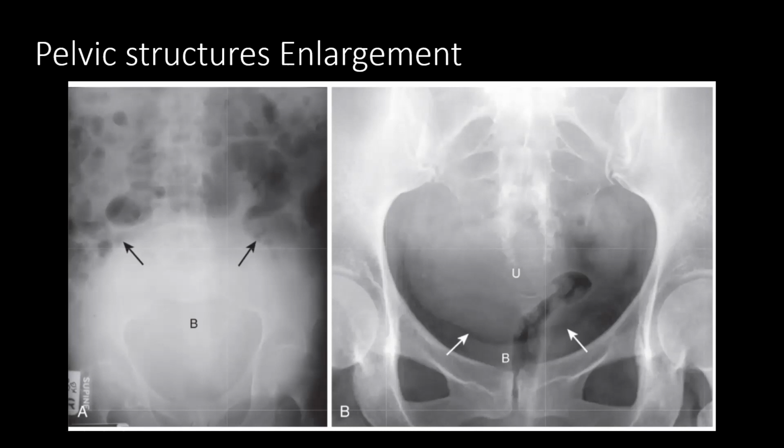When I have this enlarged shadow, the first thing that I will say is that it's probably an enlarged bladder.